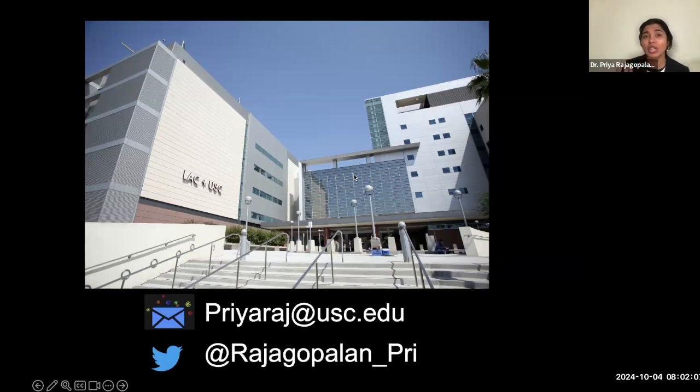So one patient I remember presented with all this destructive appearance of the bone from lymphoma and ended up having extensive enhancement going into the spinal canal itself. And it was actually read as possible discitis osteomyelitis in that patient. And then it came to me for biopsy. And so I ended up biopsying a part of the disc and part of the bone. And then it ended up being a lymphoma.